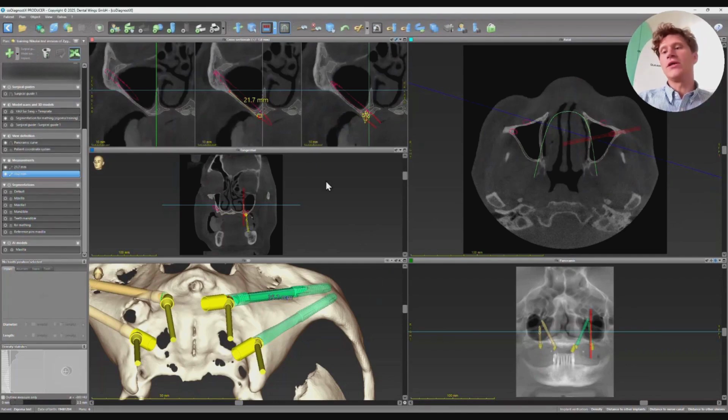And right now we need to upload these cylinders in the system. You know that we can upload from step number 4, but if we select step number 4, we cannot change position of these objects, and we need to align with something, but we have option to make it also easily, and we will have a possibility to move this object as well.